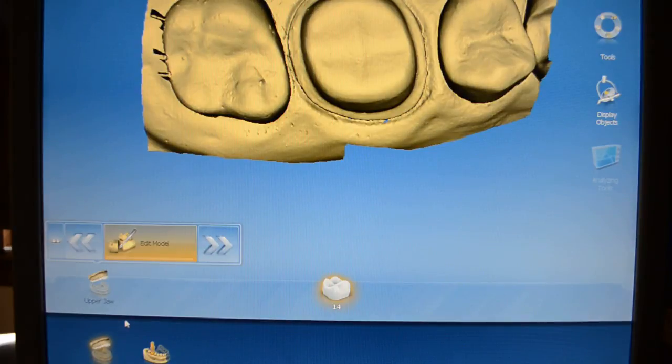Takes a few seconds, not very many as you can see. And what we have is our model. So when we were in administration and telling it what to do, administration was highlighted in this gold color. When we needed to take pictures, acquisition was highlighted. And when we became the model phase, models highlighted.